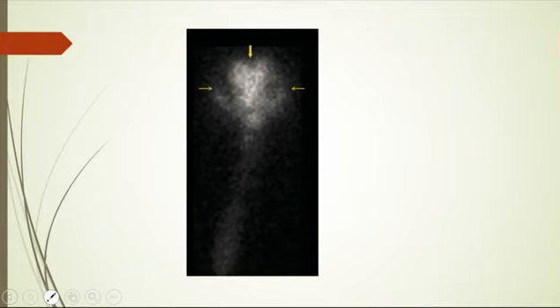Something that we are all deficient on. What's this? What's the modality? This is the spine and the brain. What's the modality? Nuclear medicine. This is a cisternogram using indium-111 DTPA. Intrathecal injection. They injected by lumbar puncture and then they follow the radioisotope. Okay, you can see it's ascending up, covering the brain.